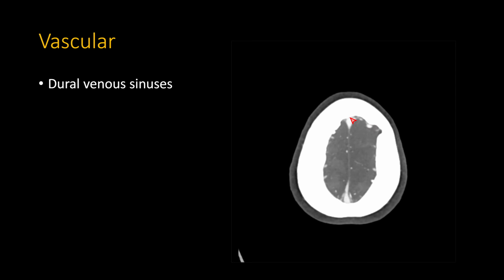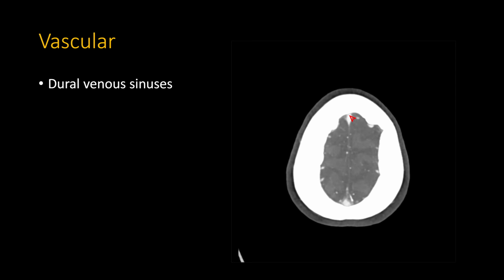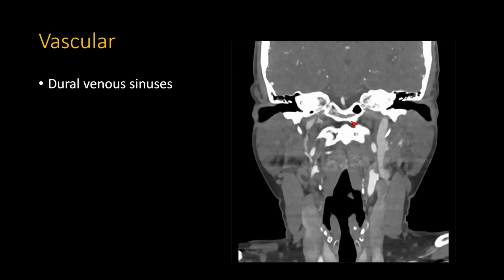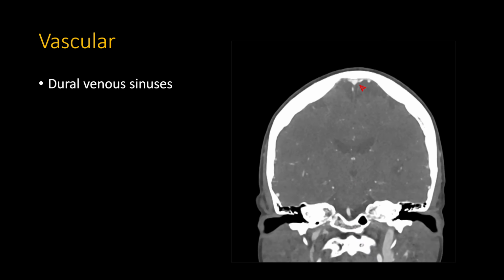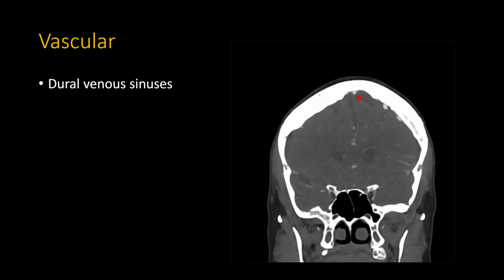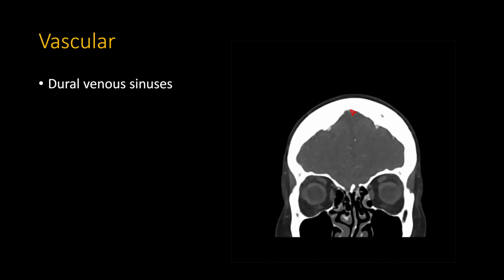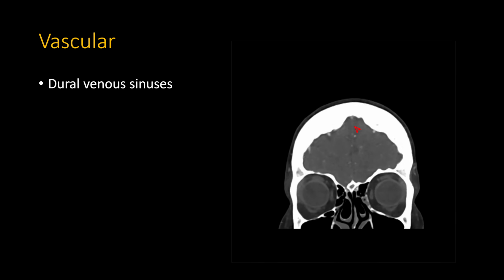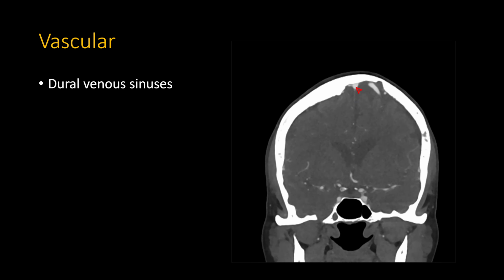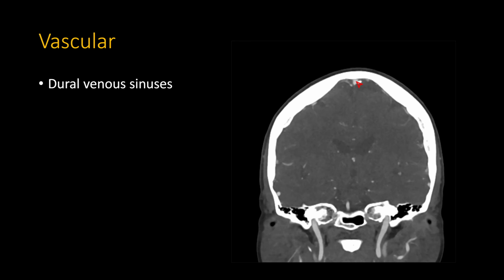So you have the superior sagittal sinus. Superior sagittal sinus shows up the best on coronals. So let me bring it up into view here. So that's the superior sagittal sinus. You might have to adjust your windows a little bit to best assess the venous sinuses compared to the arteries. On coronal, you can see it in cross section nicely, and you go from anterior to posterior. Here it is. See it pretty nicely. No stenosis, no narrowing, no thrombosis.